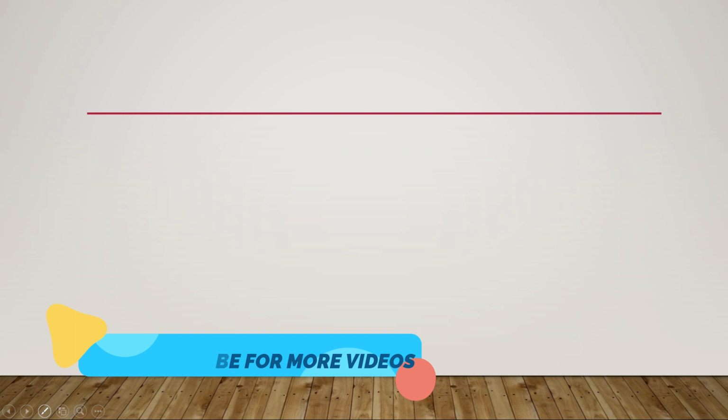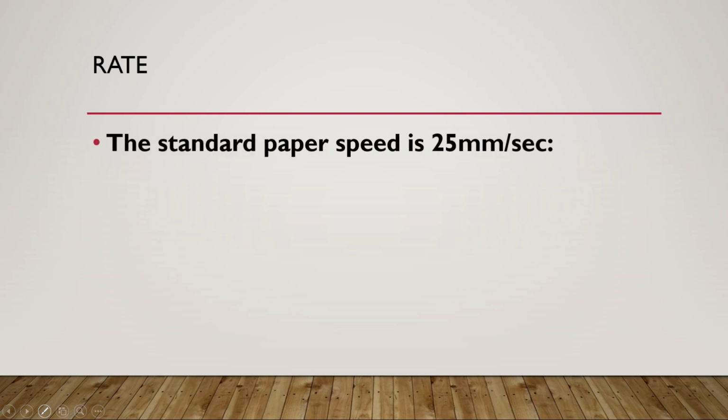So let's begin the discussion on ECG basics. The first thing which we will look at is the rate. For accurate calculation of heart rate, we must first know the standardized ECG.